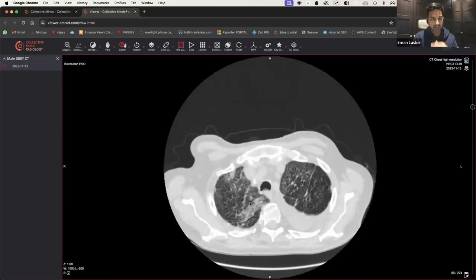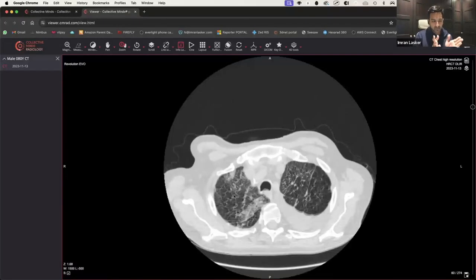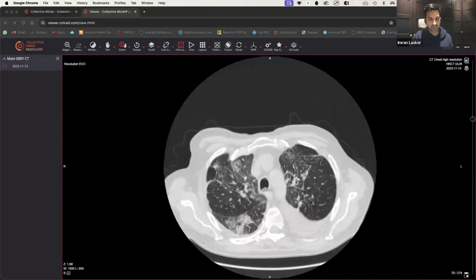When you see these areas over here, can you see around here, the lungs don't look very well defined. They look kind of wavy. They almost look like little seagulls, right? So I'll try and draw a seagull for you. If they look like little seagulls, then they've had a lot of breathing artifact that's degrading some of these images.